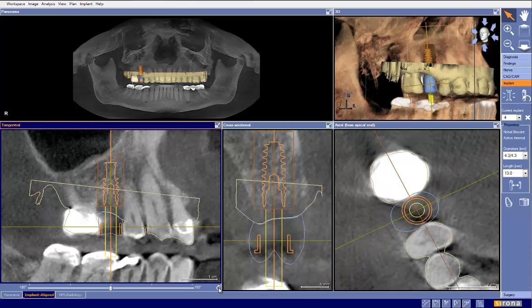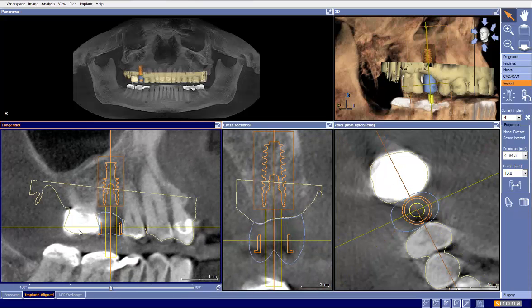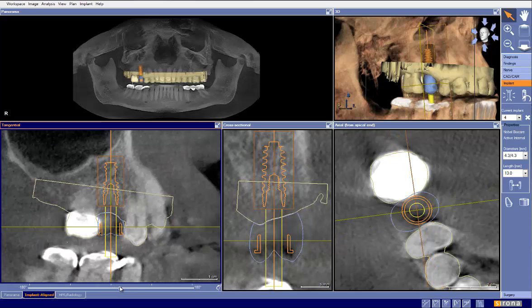So the next thing we need to look at is our occlusal plane. And in looking at that, we can see here that it looks very nice. No big issues there. And the last thing we want to do is check our guide sleeves. And here we can notice that we may have to adjust the adjacent teeth. So what I would like us to do, when we order the guide, to avoid any type of delay in manufacturing, is go ahead and make a note that you intend to adjust the teeth to allow the guide to fit. And then we'll go ahead and do our 360.